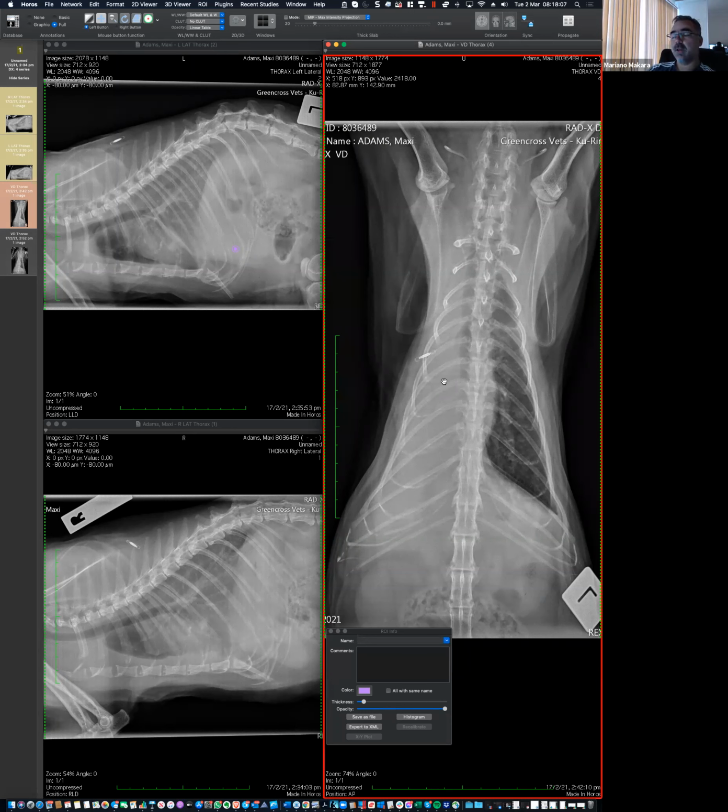So perfect thinking that it could be, we cannot be 100% sure that this is not all pleural effusion plus complete atelectasis of the lung lobes. But based on the lack of mass effect, mediastinal shift, and the complete absence of any border suggesting that there may be a lung lobe there, I think it's less likely. Okay, so hopefully the thinking is visible there. Any other option?